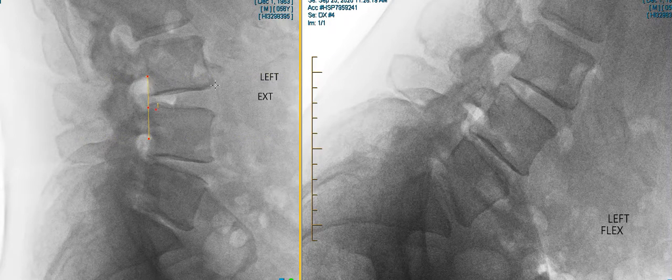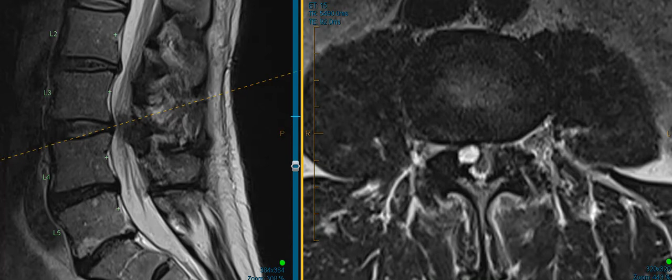If it's not, and I'm sure on another video I'll show you a slipped vertebrae, this is not slipping when he leans back, and over here on the right it's not slipping when he leans forward. This line is maintaining normal alignment, so that is a good thing. Okay, so back to the MRI. This patient's not developing any slippage. He's got a problem in the facet joints. He's got stenosis.